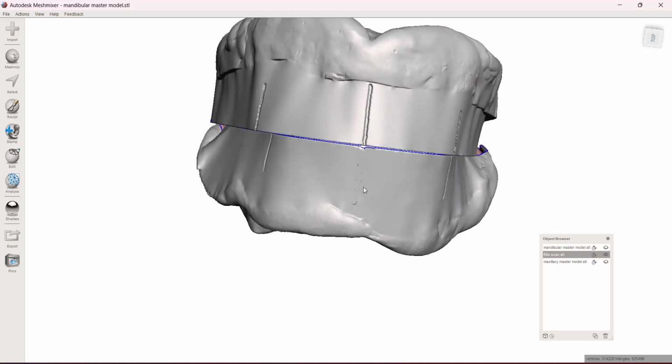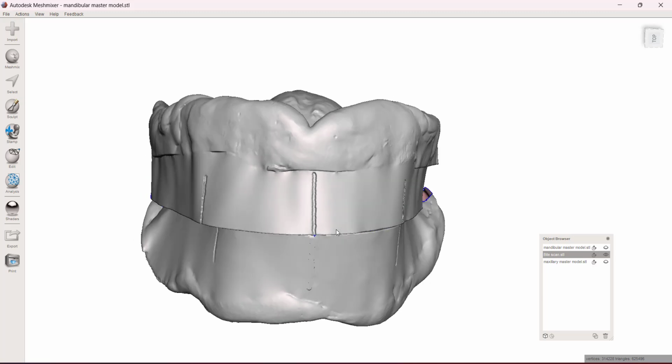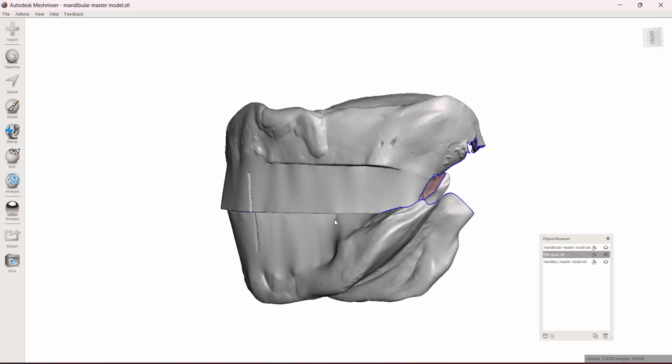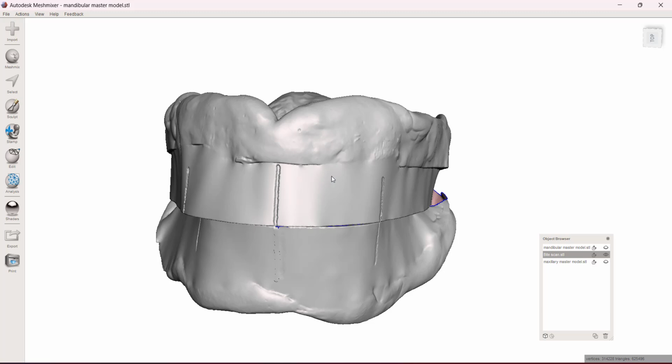Okay, so if you ever do this, the best way I found to create your denture records: intraoral scans are not great because you're going to stretch the tissue, borders are going to be bad. Do a physical impression and then go back and scan that, preferably on a desktop scanner, so you could scan the upper denture. And I usually lay it, teeth or record side down so that you pick up all the internal, and then lower, and then rubber band them together and scan both of them together for your bite. And now that becomes your record.